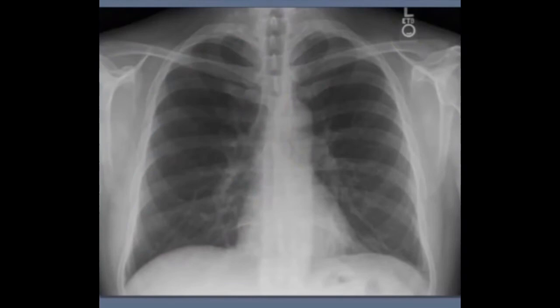The next thing I like to look at is B, or bone. So I like to look at and compare the bony structures, paying very close attention to site, size, shape, shadows, and borders. You've got the clavicles right here. Okay, so you can look for any kind of fractures.